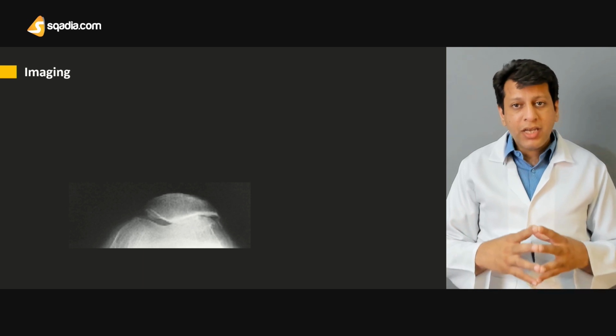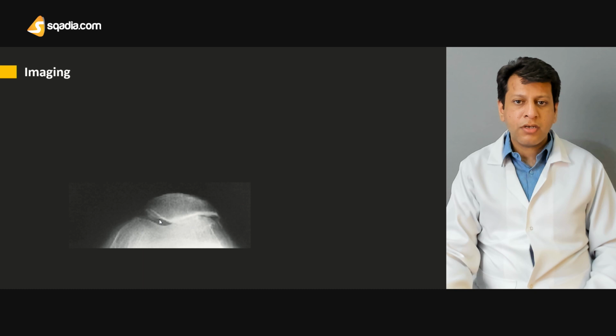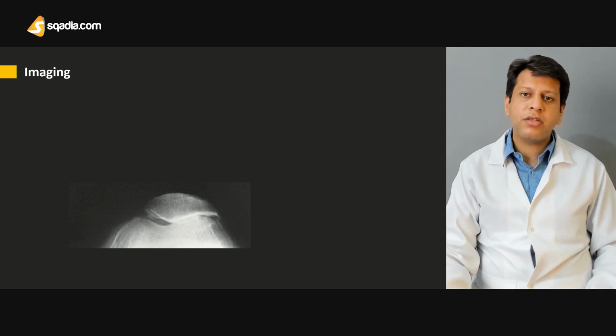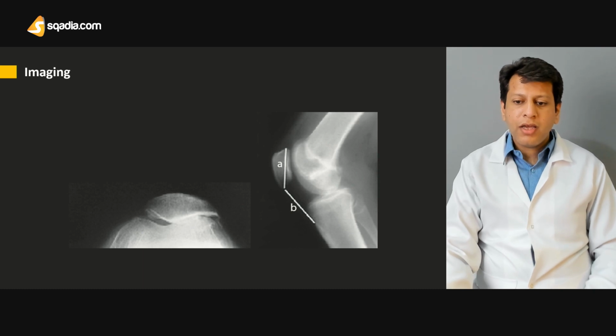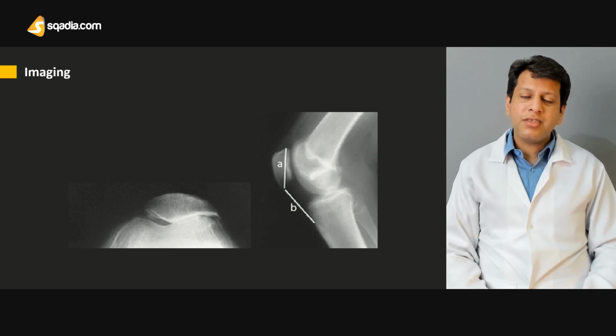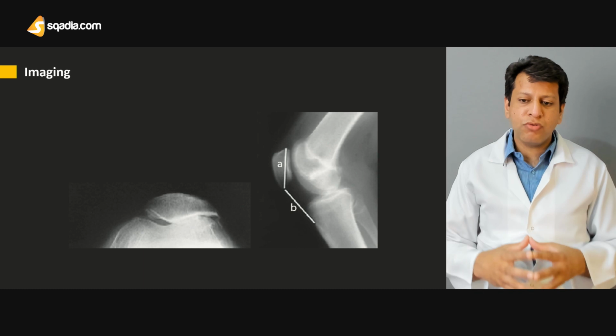What we need to see on these X-rays is that, if you look clearly, you can appreciate increased lucencies, sclerosis over here, as well as some degree of osteopenia in the subchondral bone. Compared to this side, you do not appreciate increased sclerosis and osteopenia, but on this side, you can. This is usually classically seen on the lateral as well as the sunrise or merchant views. And on the lateral view, you can also appreciate some sclerosis as well as subchondral osteopenia. These are the signs of development of arthritis, which will eventually lead to patellofemoral pain syndrome as well.